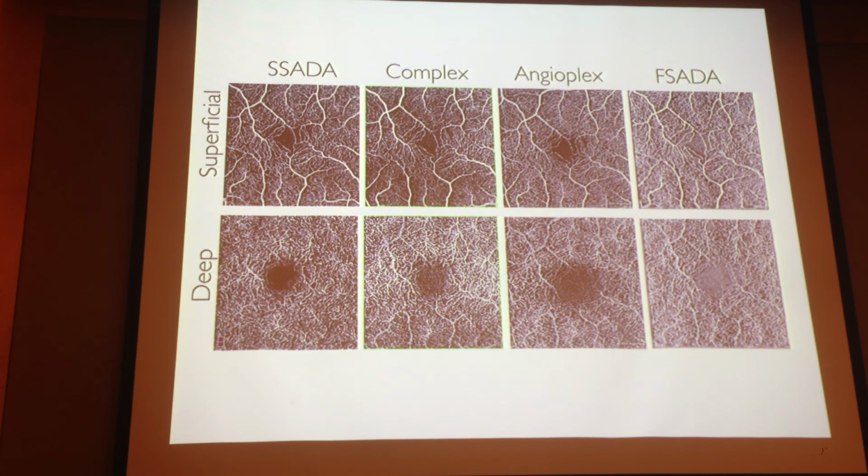I can answer the same way that I answered before. If you have an OCT reflective image where hard exudate, for example, is masking, edema by itself is not masking.